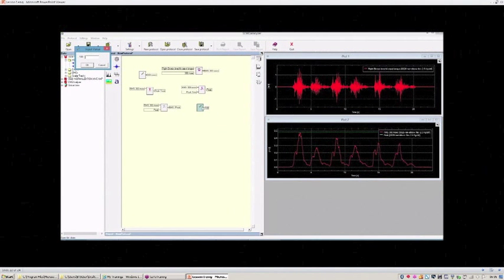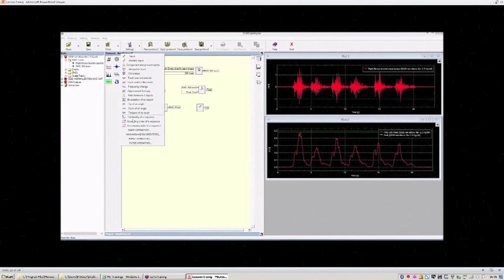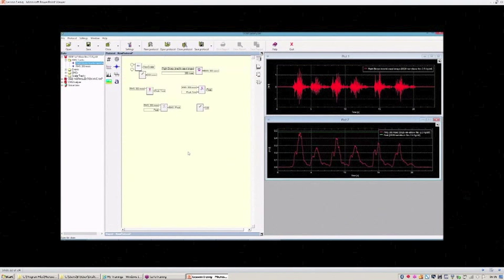So we define a scalar input of 100, and now we can perform the multiplication between the two objects.